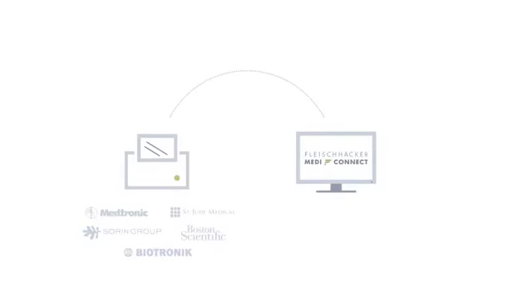One of the core competencies of the MediConnect software is the digital processing of pacemaker follow-ups. This short video tutorial will familiarize users with the respective processes. MediConnect imports data from all devices, from the major manufacturers of ICDs and pacemakers.